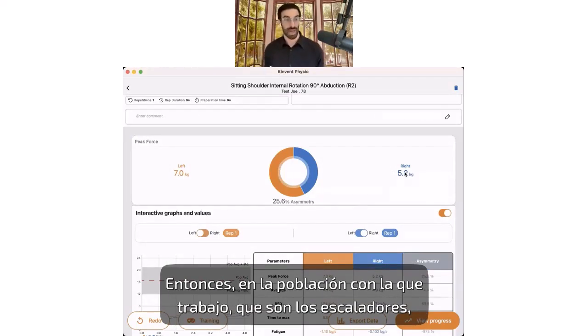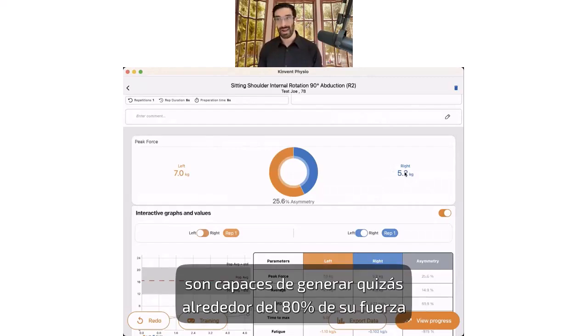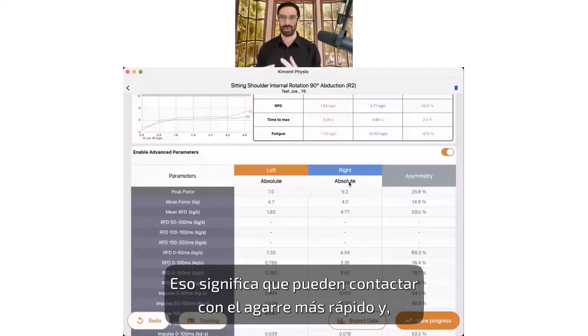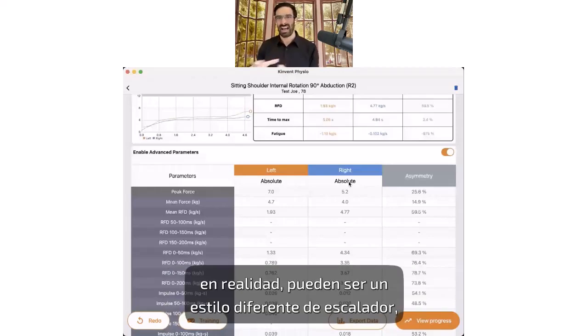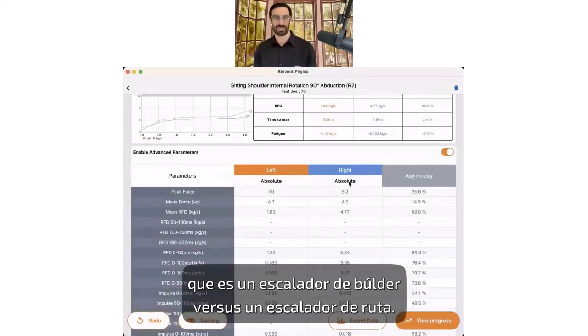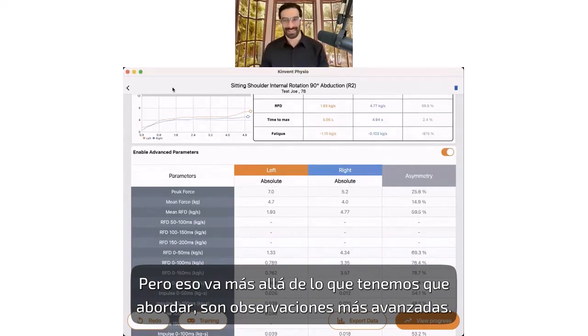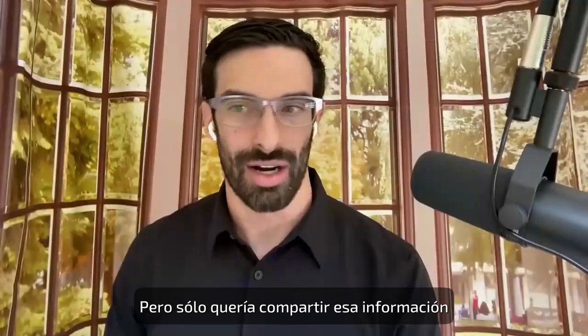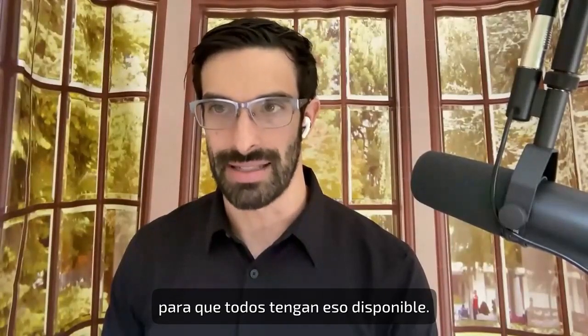So in the population I work with, which is rock climbers, they're able to generate maybe about 80% of their force in the first 0 to 50 milliseconds. That's great. That means that they can contact the hold quicker, and they may actually be a different style of climber, which is a boulderer versus a route climber. But that's beyond what we need to go into. That's more advanced observations. But I just wanted to share that information so that everyone has that available.